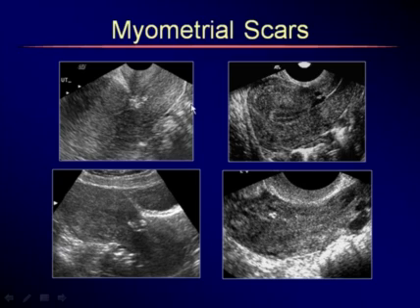So you will see a variety of appearances, sometimes just a fluid-filled cavity. One should pay attention to the thickness of the covering myometrium. If you see that it's extremely thin, that would be worth reporting to the clinician. And this is the site where ectopic pregnancies sometimes like to set up households. So that covering of myometrium, if it's extremely thin, could be the site of a dehiscence.